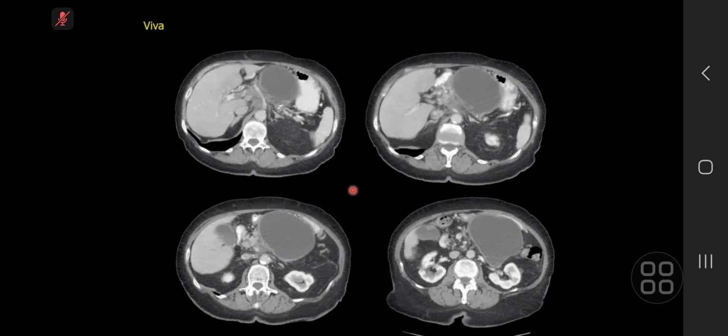The cystic lesion, I'm not sure if this is a separate entity and represents a mucinous cystadenoma with a pancreatic adenocarcinoma. Or you are very, very close. Is there a complication of the pancreatic adenocarcinoma? Yeah, absolutely. This is malignant transformation of a mucinous cystadenoma.